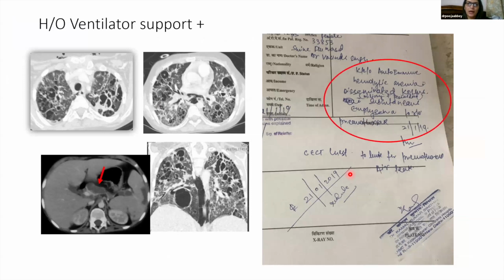So this was a child with autoimmune hemolytic anemia, receiving steroids, who developed disseminated tuberculosis, basically a miliary kind of tuberculosis. Then she had been admitted, and she had even been on ventilator support. So that can also be one predisposing cause for why she developed this kind of air leak. And she developed subcutaneous emphysema, so they got a CT done to rule out pneumothorax and to look at the extent of the air leak.